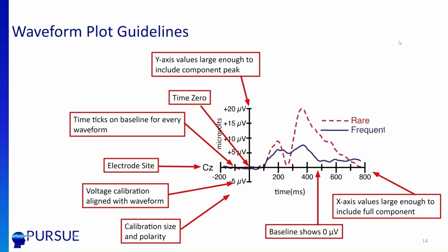You need to choose an appropriate range of numbers for the y-axis too. Your goal here is to make it so that the ERP waveforms can fit onto the graph. If the waveforms are too big or too small, then you need to change your y-axis range.